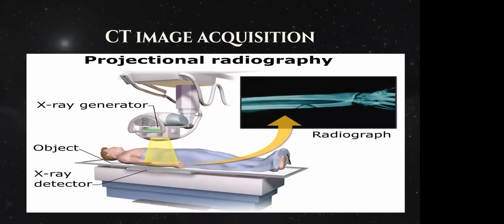This is really important to remember, because bone will always be white on CT images. And that's how you differentiate between a CT and MRI at a very beginner level. So when you see an image, look for any kind of bone, such as the vertebral bodies or cranium. If it's purely white, sclerotic, it means it's a CT image.